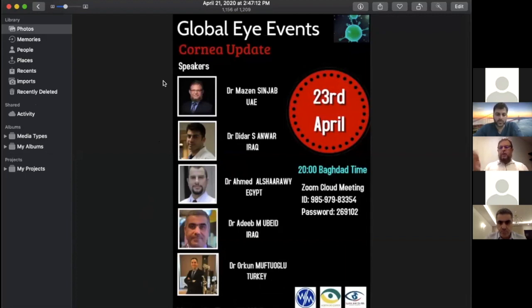Now for the first question: those who say there is nothing called forme fruste keratoconus, how do they define an entity where, for example, my right eye has an abnormal curvature map and other maps are normal, while my left eye is keratoconus? What name do they give it?